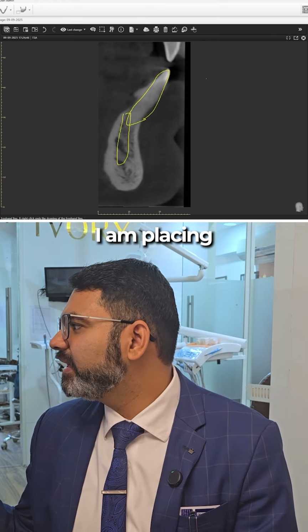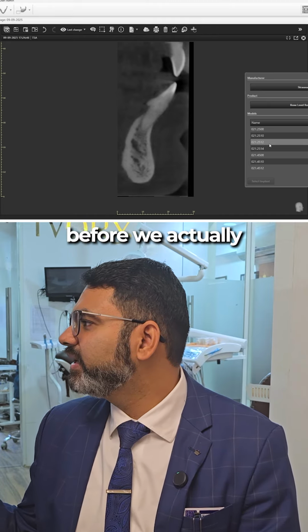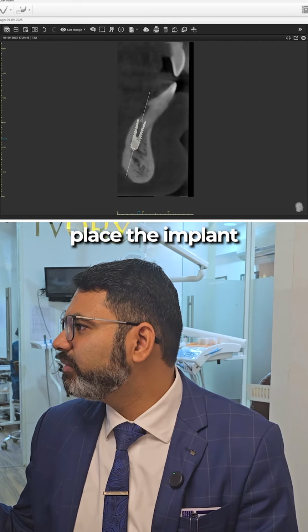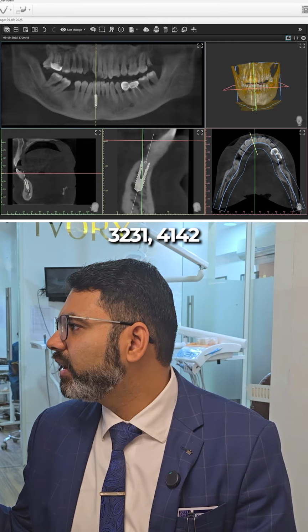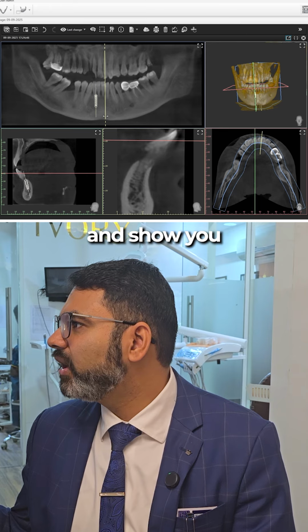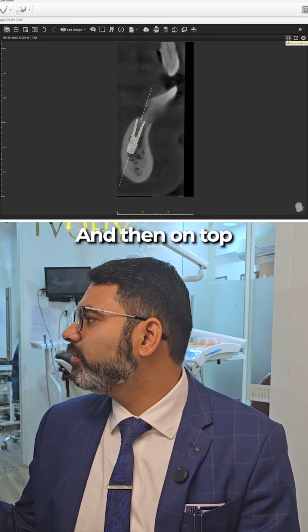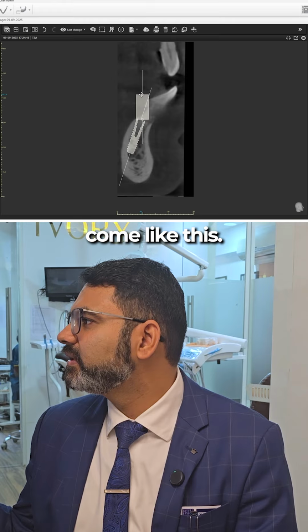So let us see, I'm placing the implant virtually first. This is like a mock surgery before we actually do it on the patients. The treatment becomes more predictable. So that's how I intend to place the implant in the bone for tooth number 32, 31, 41, 42. And now let me go on to the next tooth and show you how we do the implant placement for this site. Okay, that's it. So this is the planning, and then on top of this particular area, a new tooth will come like this.